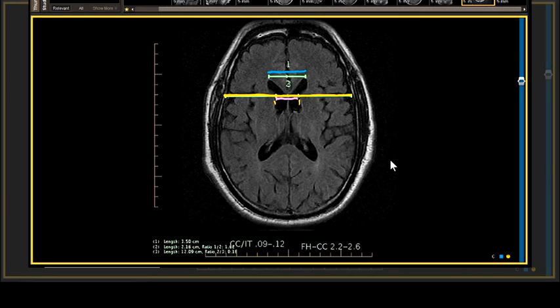Now, in Huntington's chorea, because the caudate gets so atrophic, it dominates the ratios I'm about to give you. So if we take the intercaudate distance, which is this pink line right here, and you divide it by the inner table distance, which is the yellow line, the normal ratio is somewhere between 0.09 and 0.12. As the patient becomes more afflicted with a disorder that causes widening of the intercaudate distance, this ratio number is going to go up, and in our case, the ratio was 0.16, or elevated.